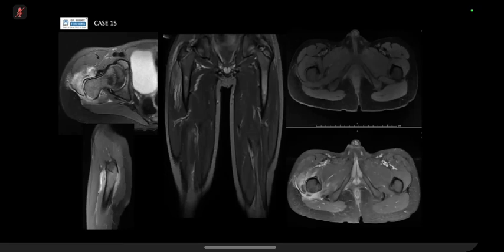You've got a few MR sequences in front of you. Do you want to talk through this case? Hello, I'm candidate 3.